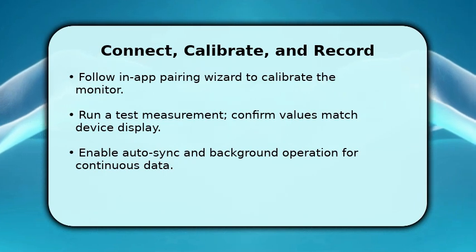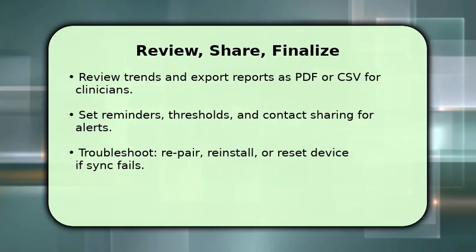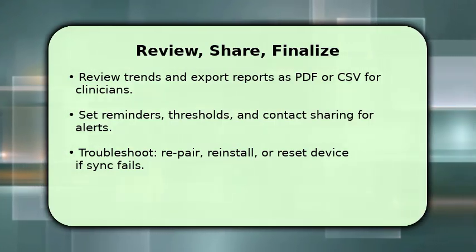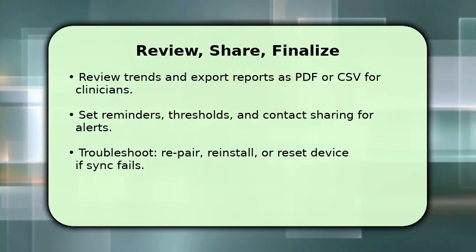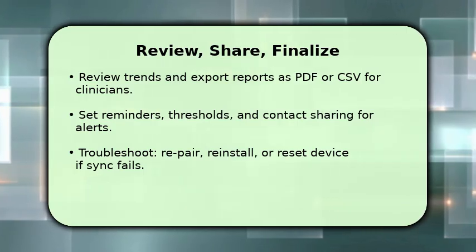You finish by reviewing trends and exporting a report as PDF or CSV when you need to share results with a clinician. Once done, set reminders, target thresholds, and enable contact sharing for emergency alerts so the app notifies the right people. Make sure backups are enabled.